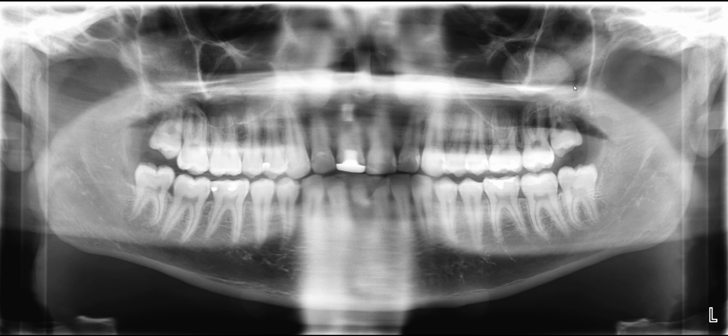Another important feature to recognize is whether this one has a corticated border or is without a corticated border. What would you say, is this corticated or not? A cortication, to me, means just like this maxillary sinus, you have a well-defined thin zone of opacity that has the density of cortical bone, which in this case certainly lacks.